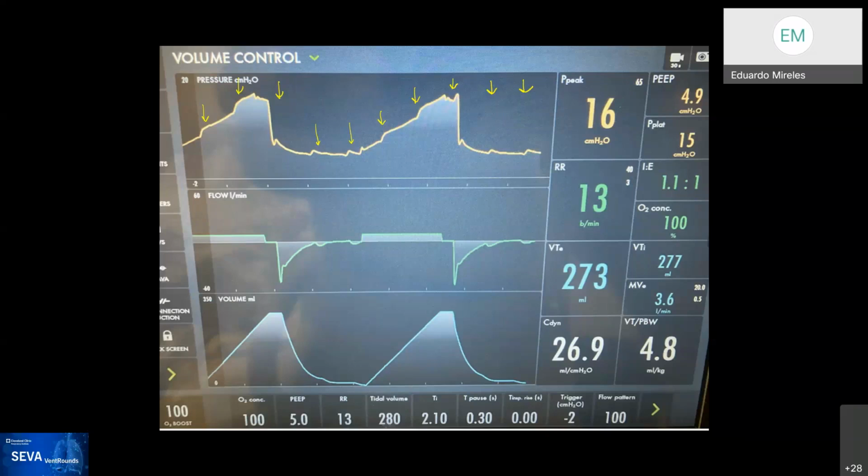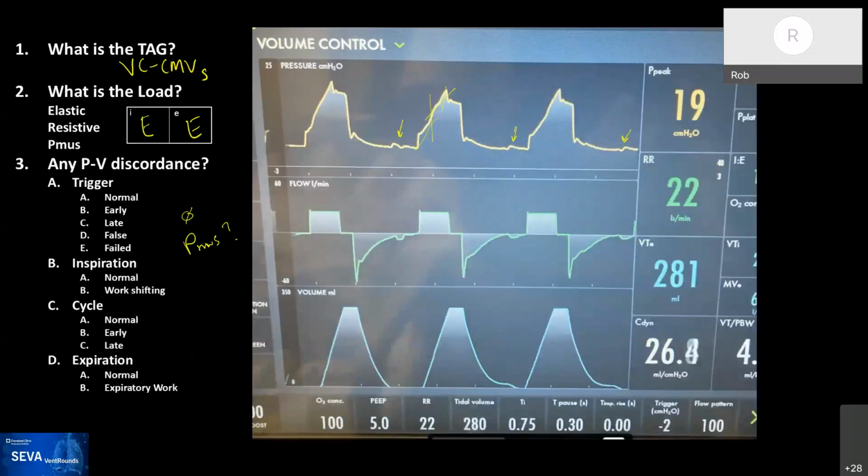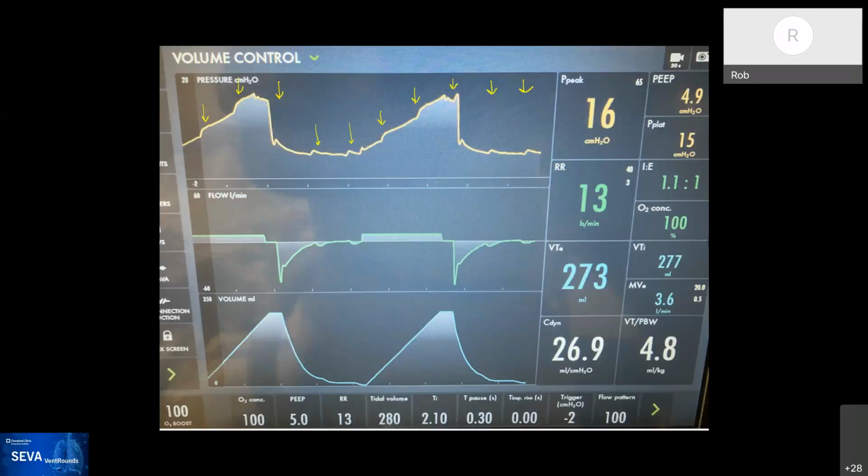Or if the patient has a very large heart on its own. Yeah, that's different. A stiffer lung will transmit vibration much better than a compliant lung. And here's another thing: since you turned off the patient circuit compliance, what does that do to the accuracy of the tidal volume display?